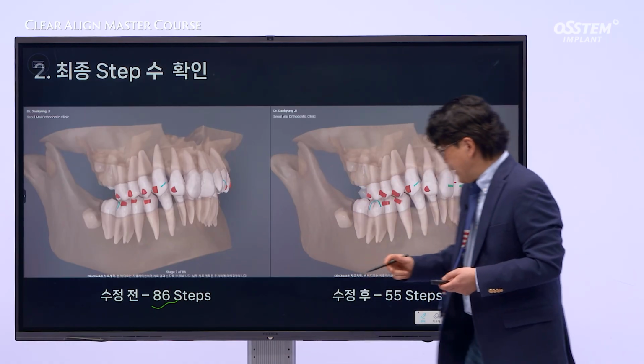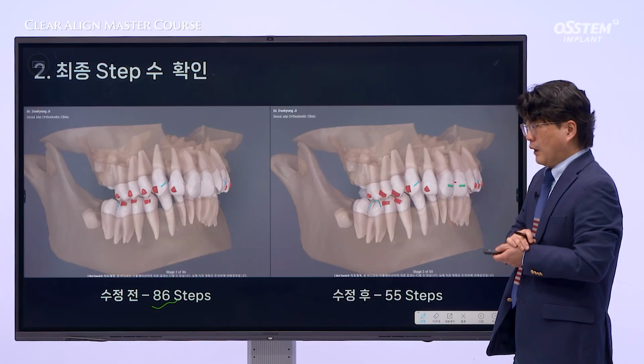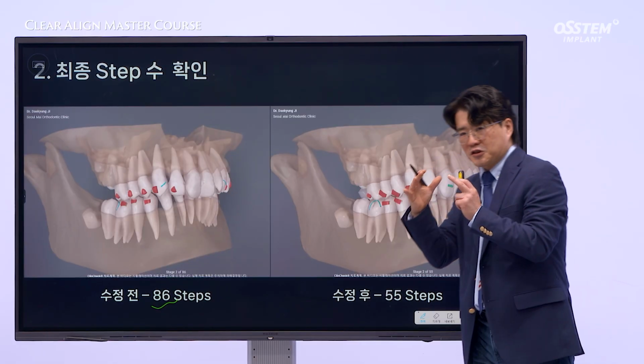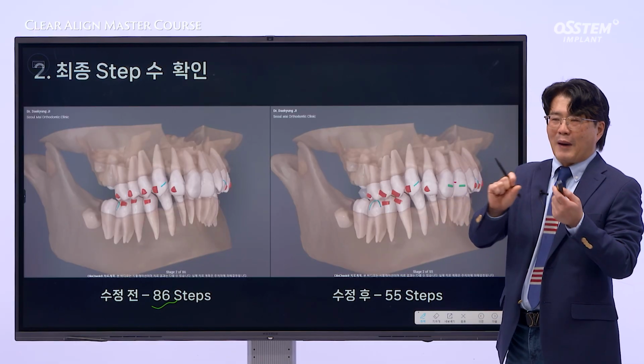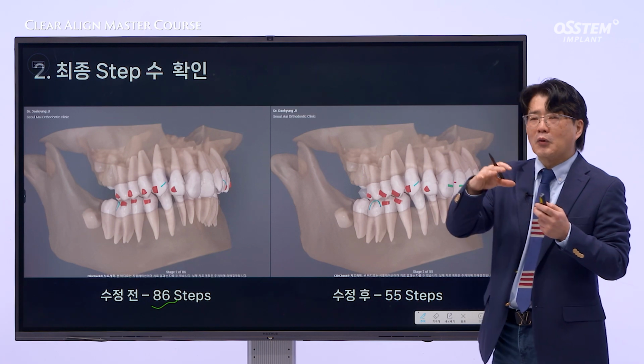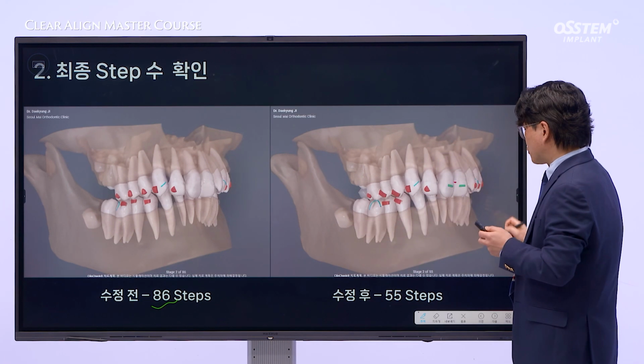Now, let's try making some modifications. What really matters in the modification process is ensuring that the planned tooth movements are reasonable, both in terms of individual movements and possible side effects. By taking these movements into account, we can sequence the tooth movements more efficiently and reduce unnecessary steps.